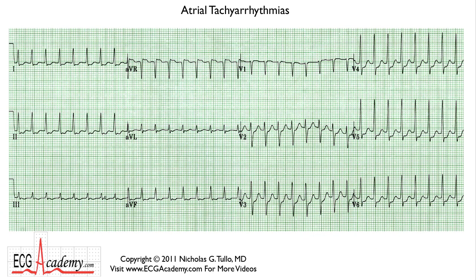Finally, I'm going to show you this electrocardiogram, which most cardiologists would simply label as SVT, supraventricular tachycardia. The mechanism is a little bit difficult to determine, but if you look at the forest, you see it's a very regular tachycardia. It's quite fast here. If you take 2 QRS complexes and measure the rate, it's 300, 150, 100. So we're talking 200 beats per minute. So at 200 beats per minute, it's regular.